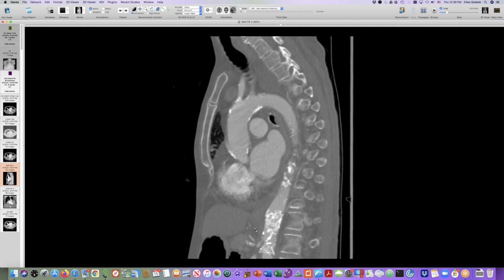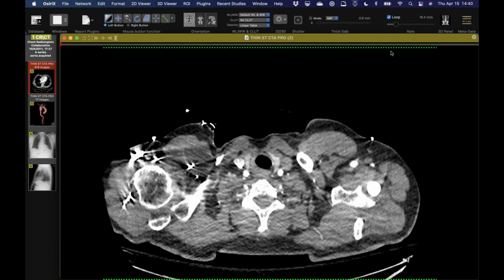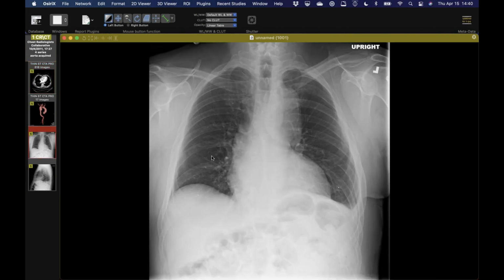Okay, I was wondering, could this be some calcification process related to renal failure, or being on Coumadin or something like that? I can't say any of that makes sense either. It's clearly filling the lumen, so there's got to be tissue or foreign material there, and there's no collateralization, so it's probably not something that's been gradual. Yeah. And the intima looks normal. I don't know what it is.